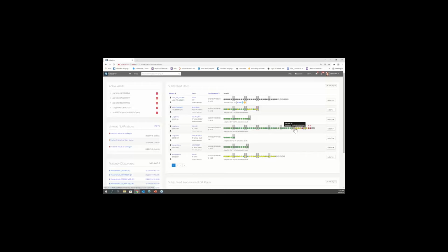Then at fraction 31, it's yellow, and we're entering a borderline tolerance or warning area. By fraction 35, we have a level below what we would like to be seeing for this patient, and so there's actually a flag here that I need to acknowledge.